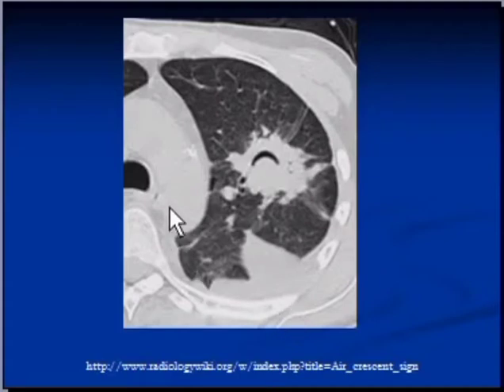Now, if I'm not wrong, this is a bronchial branch, and there is a communication channel, and this channel is supplying air to this cavity. Mycetoma can also be angioinvasive, meaning they can damage blood vessels and cause hemoptysis. Hemoptysis means coughing up blood. Hemoptysis is the most common symptom of aspergilloma or fungal infection. This hemoptysis can become life-threatening.